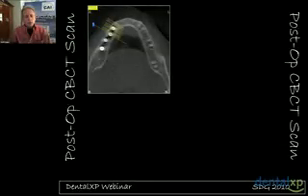And so, wouldn't it be nice to have a post-operative scan? So now we're looking at a year and a half later, and what you're looking at in the upper left-hand screen is a post-operative CT scan, cone beam CT, of the 4 implants. The dark line that you see is not bone loss. This area in between, that's called beam hardening. It's an artifact of CT and cone beam CT, and so that's nothing to be concerned about.